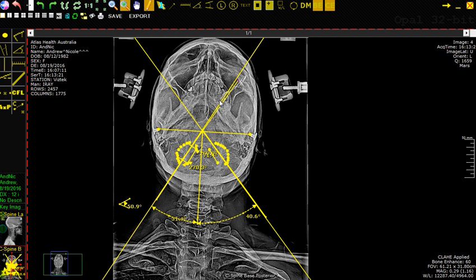There is one additional line that we do also like to have, and that is a little line that is, excuse me, parallel to the convergence angle, but it is exactly in line with the most lateral, the most outside portion of that outline of the lateral mass. And so if I wanted to create that, I would have to firstly, and I'm just doing this arbitrarily, eyeballing it here, create a line that is parallel to that convergence angle that we measured. It's about there. There we go.